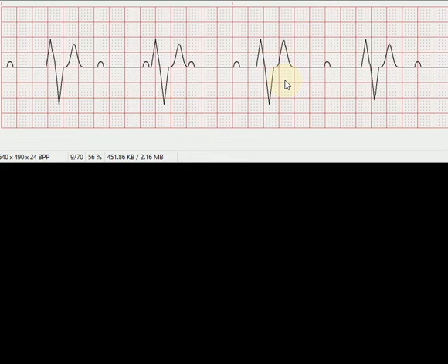Somebody that has a heart rate like this of 40, I'm a little bit concerned. They're not getting the extra boost from the atria, so they would most likely end up on a list trying to get a pacemaker in, and we're going to be talking about that in a week or two. But the key here is you being able to determine: QRSs are wide, P waves are upright, PR ratio is more P waves than QRS, PR interval is inconsistent, R to R is regular, and the rate is 40. So you can get 6 points on there even if you don't remember for sure which was which.